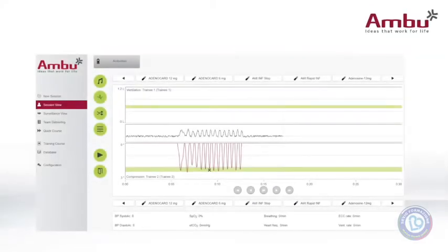The session view is a split window for the instructor. Here is where the instructor will be able to view the session in real time, getting feedback from the trainee. There is a function menu to the right where changes can be made to the mannequin on the fly during the session or scenario, such as changes in breathing, changing an ECG rhythm, updating a clinical parameter, or switching the student that's being tested. The performance graph of 2 trainees is displayed at a time to show compressions and ventilations. This allows the instructor to select events conducted during the training.